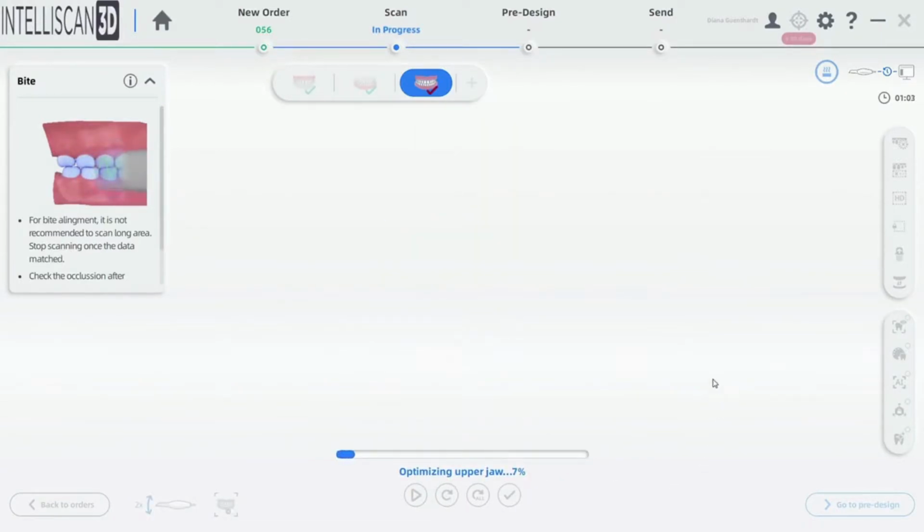And that's it. That'll get you started. But we'll have more videos to look at the great features that we have. Our oral health report, our ortho simulation, our model builder. We will go over all of that with you separately. I just wanted to get you started.